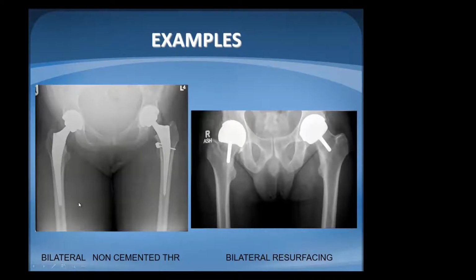Another thing that is important is the femoral stem and its incorporation into the shaft. If you look here, there is a slight alignment of the stem towards the midline, a mild varus placement of the prosthesis. It is important to remember because varus is associated with complications. This is a mild varus. The incorporation, as you can see here, is perfect, and I don't think this should be any big reason for worry.